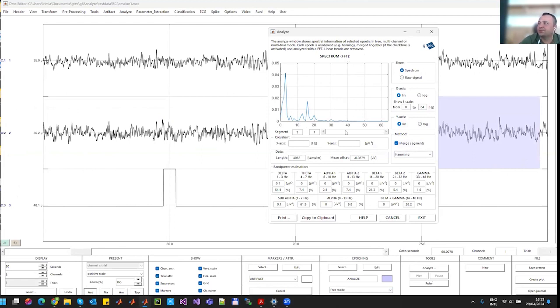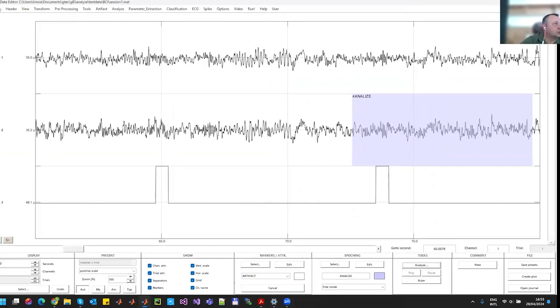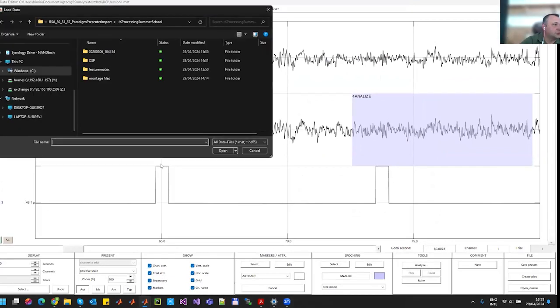Okay. Danut, there's a question, which was, could you please explain the small green area under the curve again? So this was the significant value. Yes, of course. Just one moment to regenerate it.